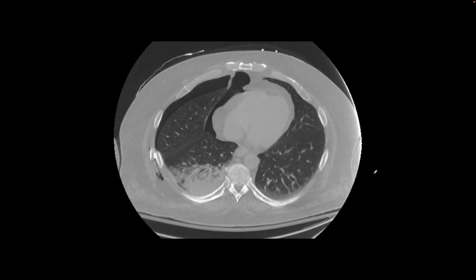This is our next patient. They came in with history of trauma, and here is the abnormality. The displaced rib fracture, because of which the pleura has been disrupted, and there is a pneumothorax on the right side. The interesting finding here is this part, which shows atelectasis. It's rounded, and we see the vessels in that fashion inside the atelectasis. So this is called rounded atelectasis.